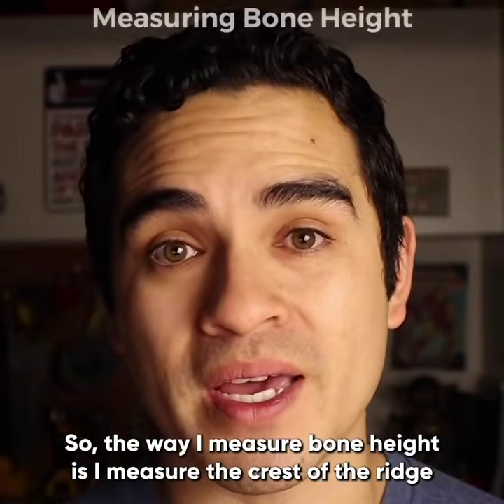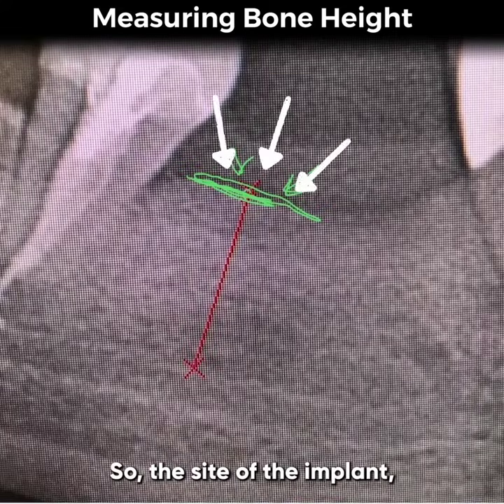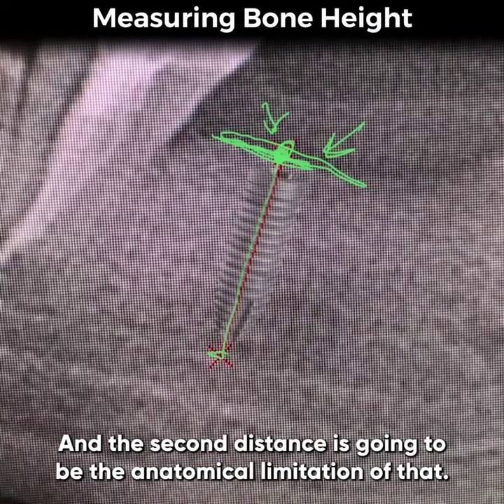So the way I measure bone height is I measure the crest of the ridge where the tooth is going to emerge from. So the site of the implant where the crest of the ridge is, where the bone level is, right? So that's my first distance. And the second distance is going to be the anatomical limitation of that.